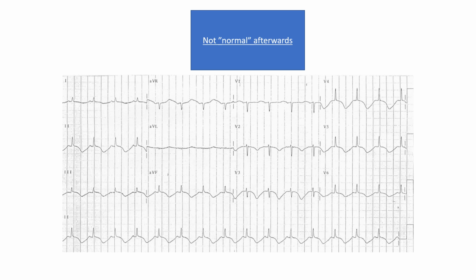Okay, so ignore this. Here you have some really deep T waves in almost all leads here. And really deep T waves, depending on the history, in someone who's just syncopized, without, importantly, T wave inversion here in V1, and V3 has, but not here.